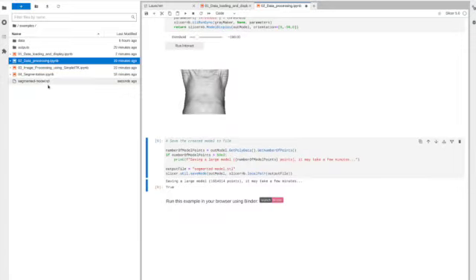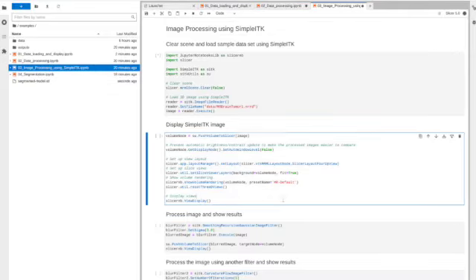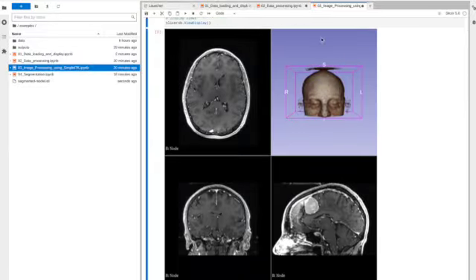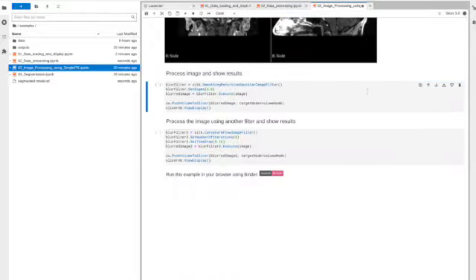So this is save the model. Let me just, bear with me. Yes. Okay. So once again, we have what's called the 4-up view, which is the face. And by the way, this is essentially the data that just comes with installation. But there is software, if you're concerned about the face reconstruction, you could blur that out if you're using your own data.